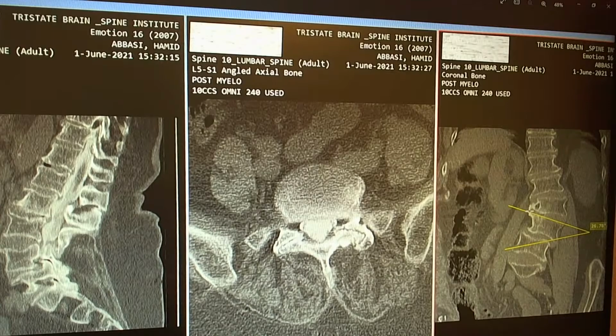Now, this joint in the back, what do we call it? One side is more like normal, the other side is not normal at all, and one almost goes around the other. We call that hugging. What's the name of this joint? No, that's not the sacroiliac joint. This is the back, and this is the spinal canal. This is the iliac crest. The iliac bone is far away from this, so this cannot be the sacroiliac joint. Facet joint, right? Yes, Neil.